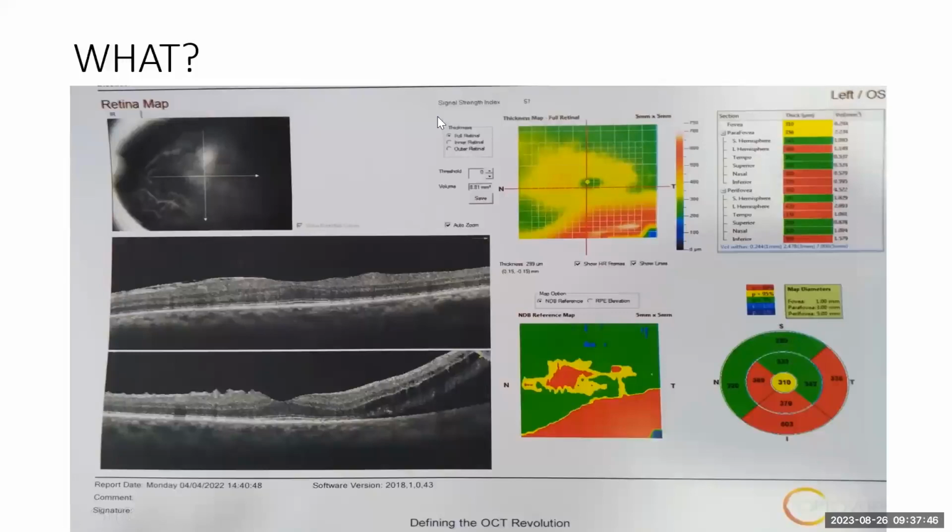Okay. Let me see. Okay, there is a message here: ELM distortion. Okay, it's not schisis, please. In schisis, you would have wide spaces and you see the fine lines, okay? And with the history, I think you know it's not schisis. So this is an inferior RD. On the macular map, you may see this and say, oh, it's edema to one side. No, the separation is the neurosensory retina is pulled from the RPE. So it was an inferior RD.